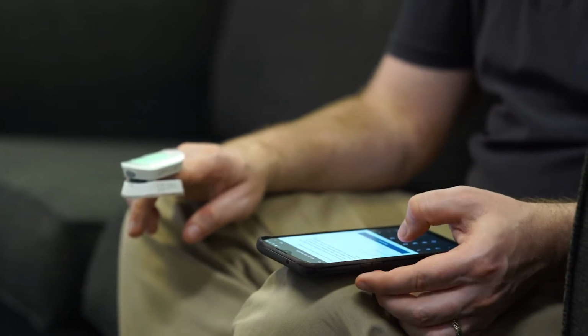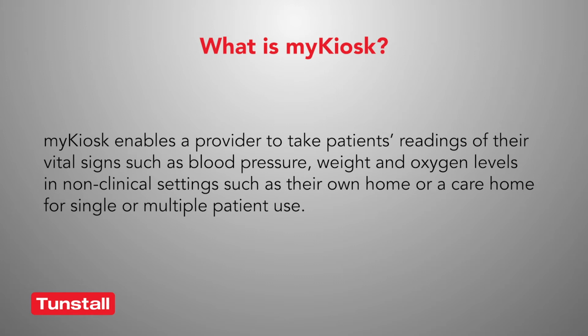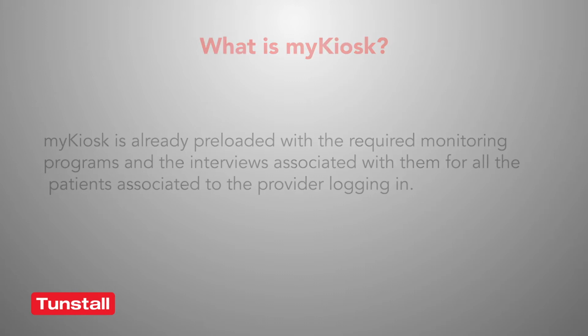What is myKiosk? myKiosk enables a provider to take patients' readings of their vital signs such as blood pressure, weight, and oxygen levels in non-clinical settings such as their own home or a care home for single or multiple patient use. myKiosk is already preloaded with the required monitoring programs and the interviews associated with them for all of the patients associated to the provider logging in.